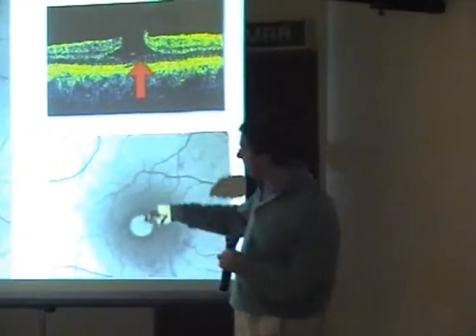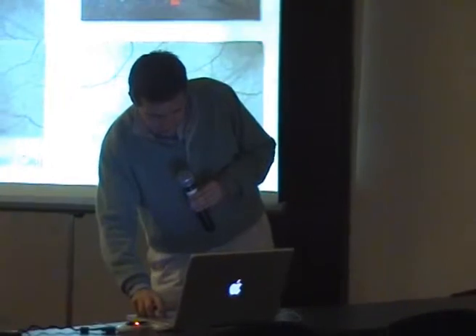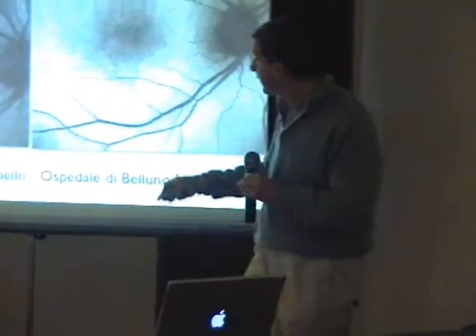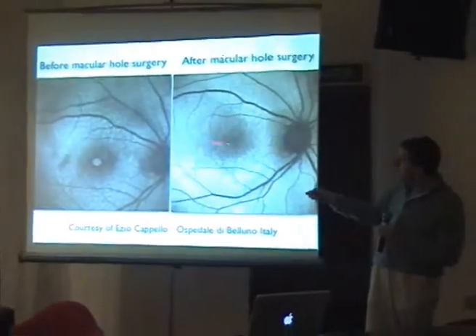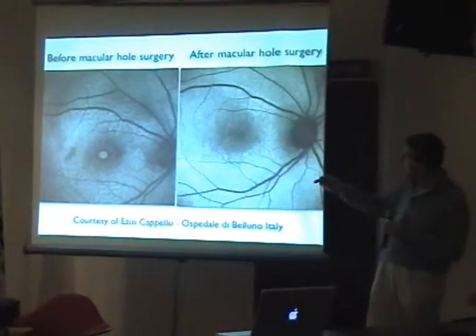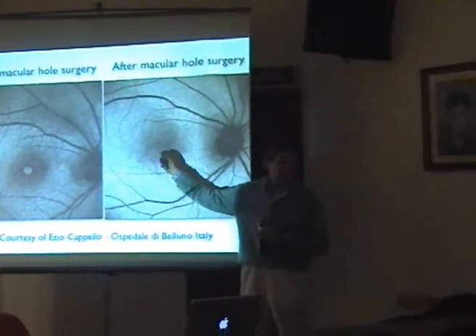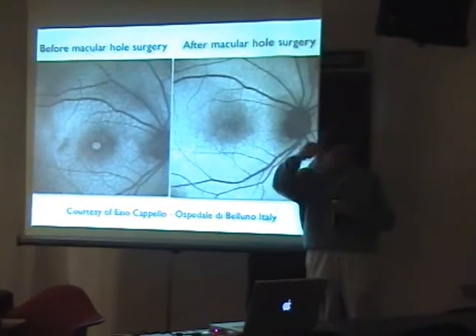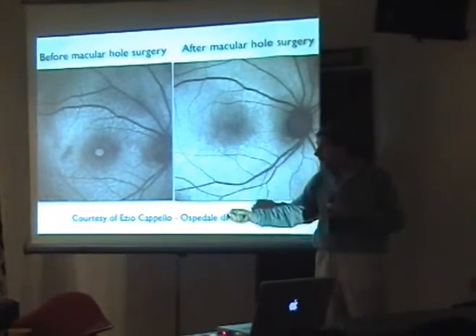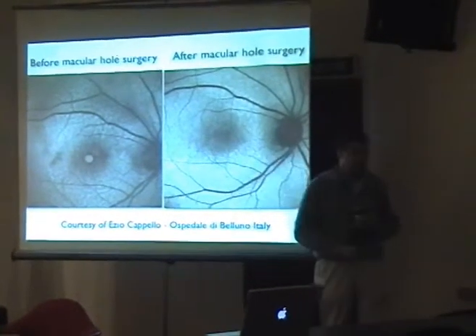But you see, you can actually differentiate the macular hole. And you can actually see if surgery did well, because there is a strong correlation between the disappearance of increased autofluorescence in patients that did well for visual acuity over time, compared with people that still have some fluorescence in the center.